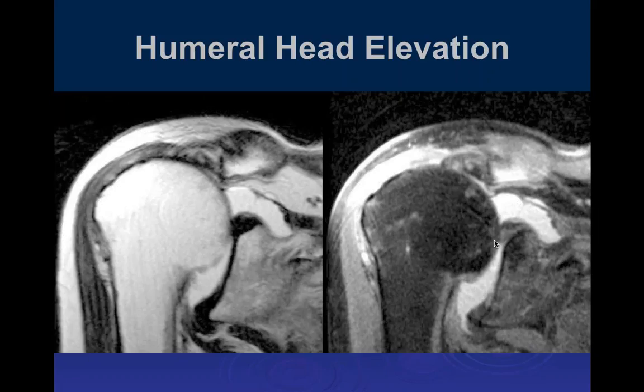And you can see how unstable this joint space is with the humeral head really well out of position with respect to the glenoid. So he really would like this described, and give an estimate of how much superior migration there is, the fact that you have bone-on-bone articulation, and there's actually been remodeling of the acromion process.